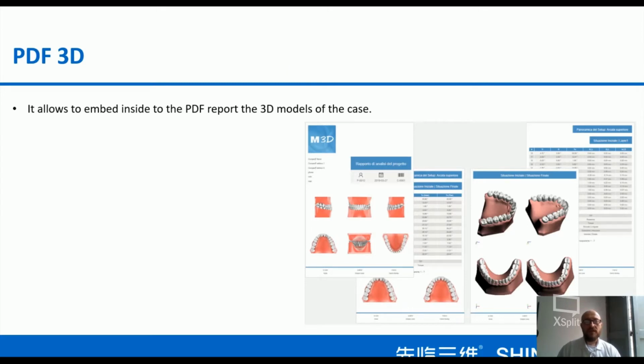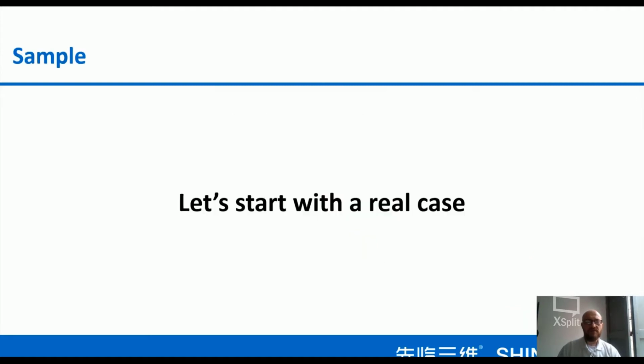Then, an info related to the final PDF report: it is possible to embed inside the PDF report the 3D models of the case. So it's very helpful, this function, for sharing all the details with the different stakeholders of this single project. I think that now we can start with the real case.